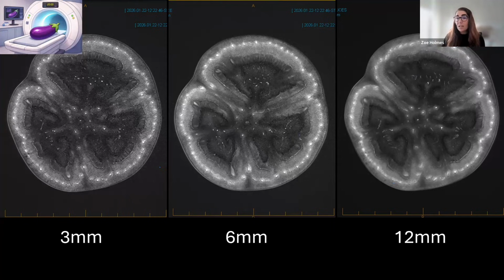So going from 3 mm slices to 4 mm gives you about a 33% signal to noise ratio boost, which can be clinically meaningful. Going from 3 to 4 mm might be perfectly fine to answer a question like, if we're doing a lumbar spine for sciatica, maybe going from 3 mm to 4 is clinically acceptable for your radiologist and the decisions being made. While we're looking at these images, we can see a beautiful scaling of our signal to noise. We are gaining back a lot of signal.